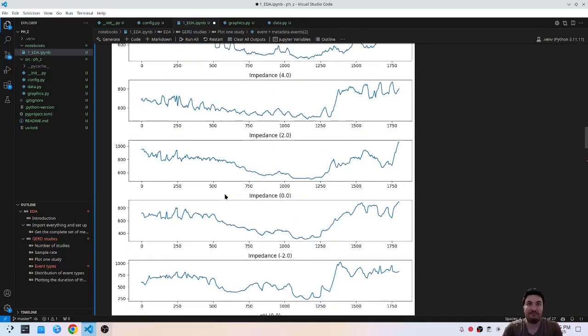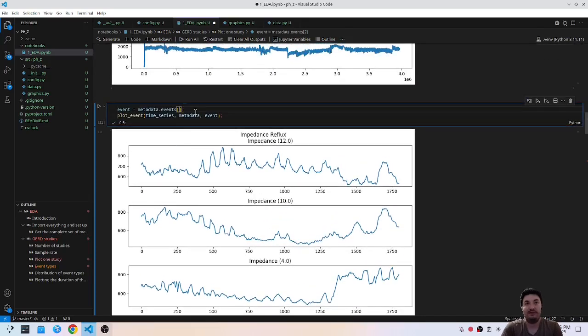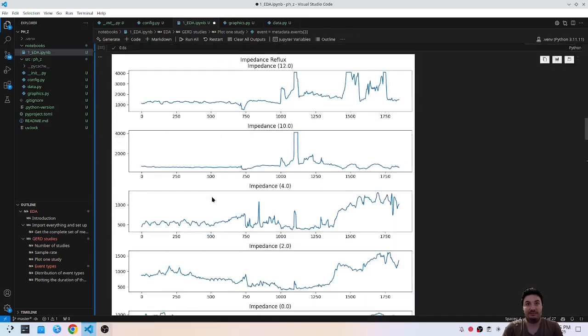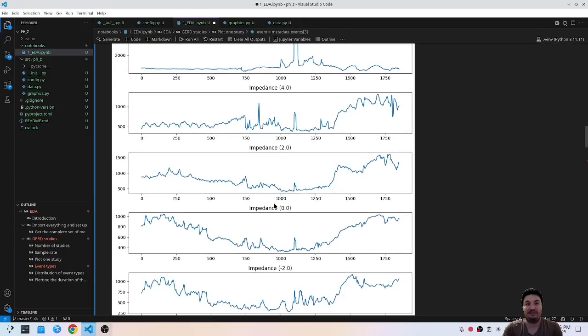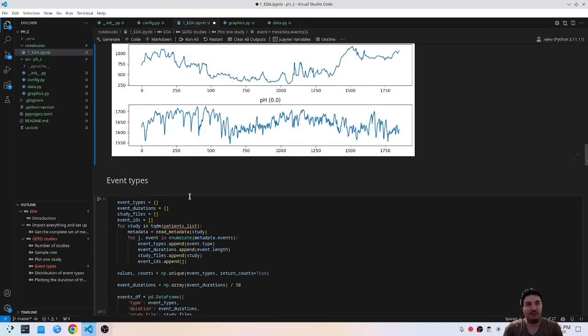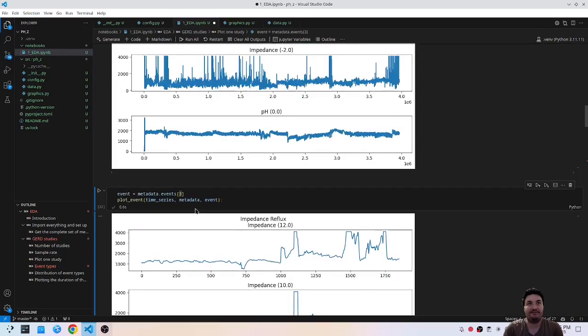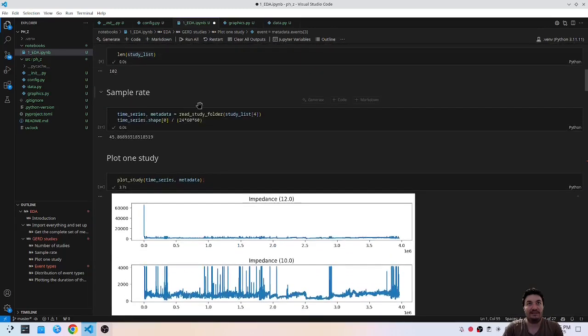This is a drop, not that clear, but it's a drop. We have here the drop, the drop, the drop, then something here. Okay, just for taking a look. Then we're going to analyze a bit further. What do we have there?